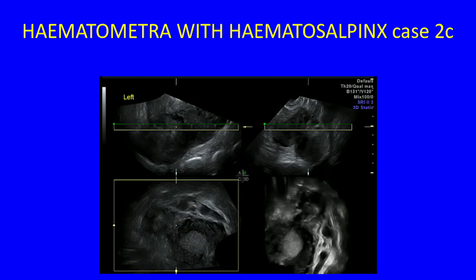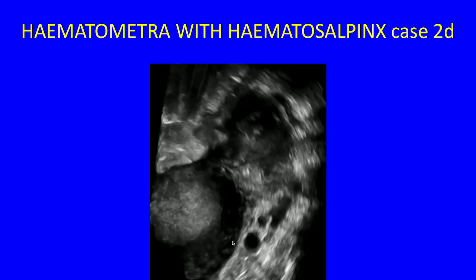until I put the 3D on. And that's, again, you just put it on your region of interest, and you end up with different planes, and you can render it. And in the rendered view, it seemed to me much more obvious.